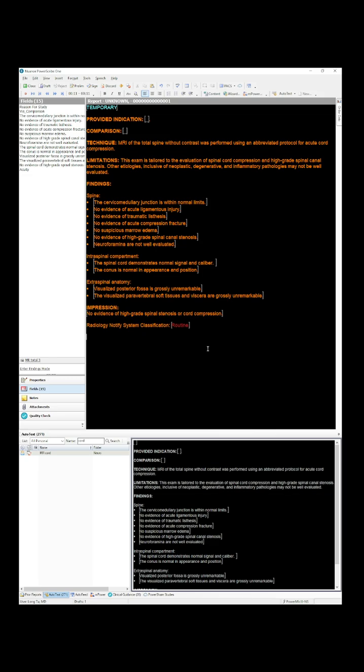Really you can't see the nerve foramina well, and you can't really evaluate the marrow signal, because I don't think we do a T1 with those. So this template really just focuses on, with some inbuilt caveats saying we were using the abbreviated protocol, literally just the pertinent positives, right?